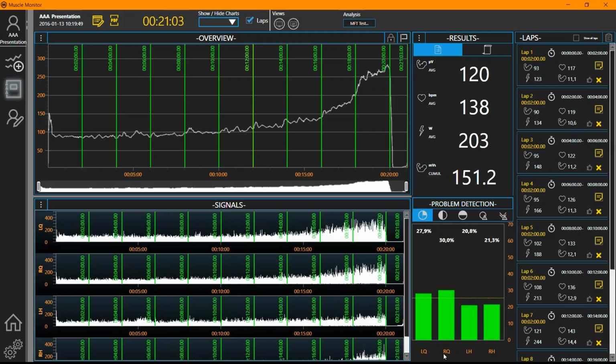Some basics regarding toes, and we have started to use this kind of traffic light system. So simply put, either the balance can be good, which is shown as green, it can be fair, or some issues, which is shown with yellow, and if the balance is very poor, then it will be shown in red.